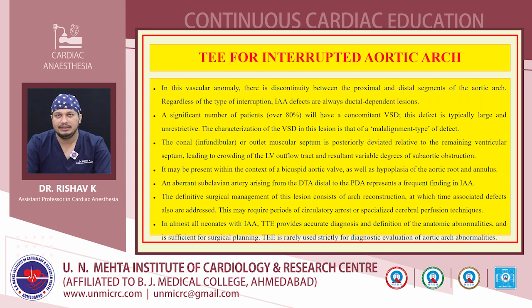The characterization of the VSD in this lesion is that of a malalignment type of defect. The conal or outlet muscular septum is posteriorly deviated relative to the remaining ventricular septum, leading to crowding of the LV outflow tract and the resultant variable degrees of subaortic obstruction. It may be present within the context of a bicuspid aortic valve as well as hypoplasia of the aortic root and annulus. An aberrant subclavian artery arising from the DTA distal to the PDA represents a frequent finding in IAA.